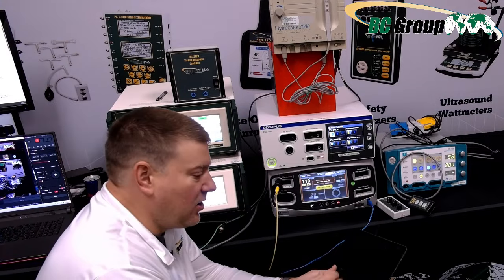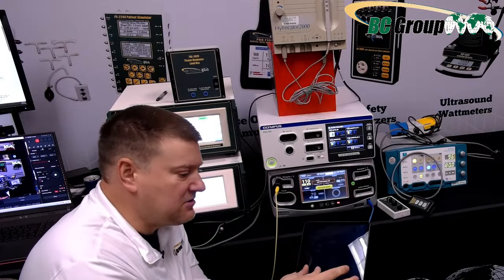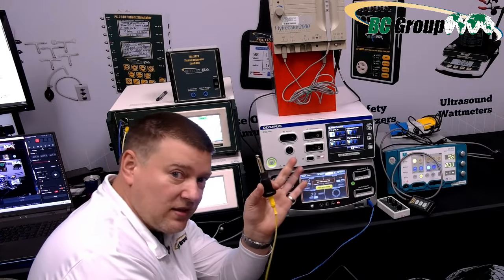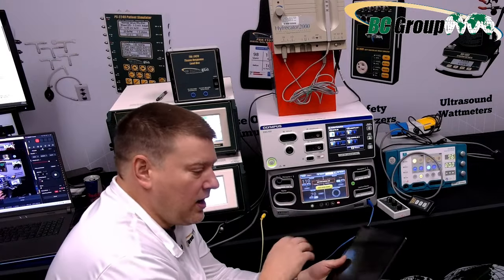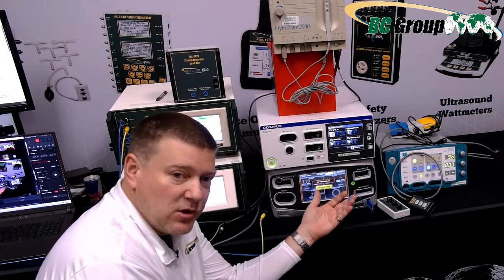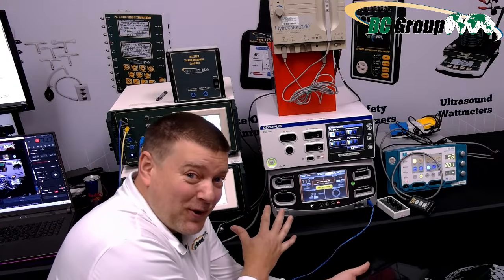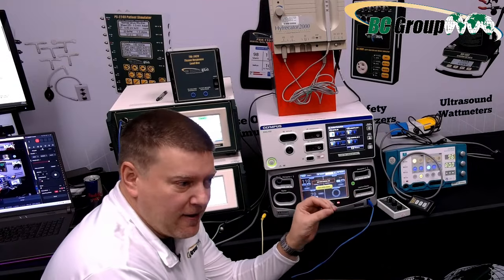So step 1, you scan the barcode on your device, it populates on the app, says, okay, here's the test for that device, and then it says, here's the test equipment you need, including the jigs. Very important to have the correct jigs, especially adapters like this guy right here. And from there, you begin the test. And it says step 1, we're going to probably measure the CQM first. And from there, you're going to follow it step by step. It's going to automatically set your resistance for you. And you're going to automatically enter when you have an alarm condition.